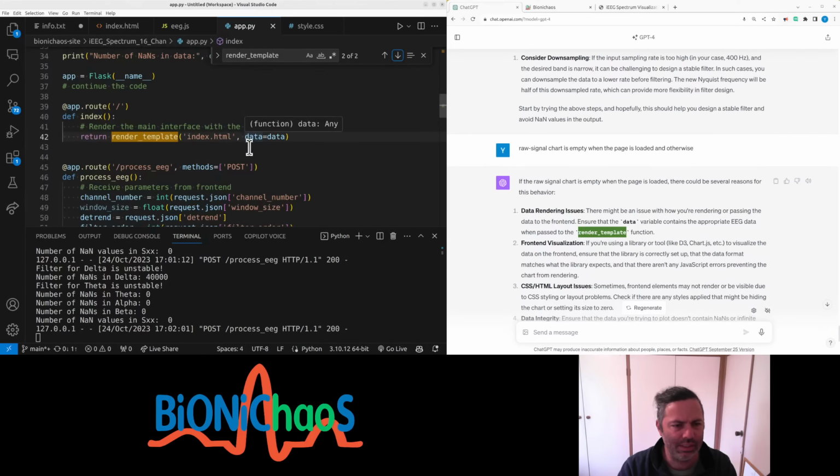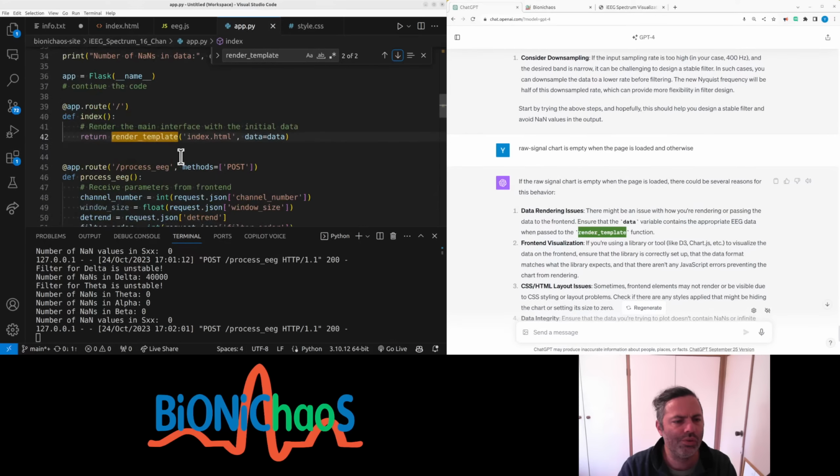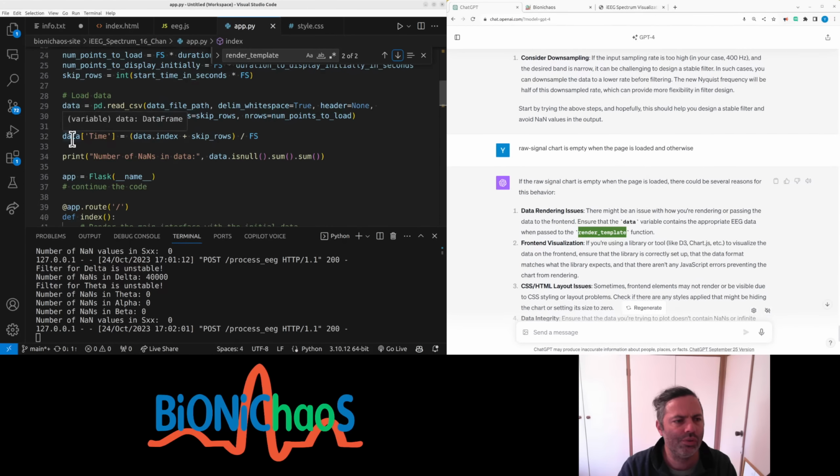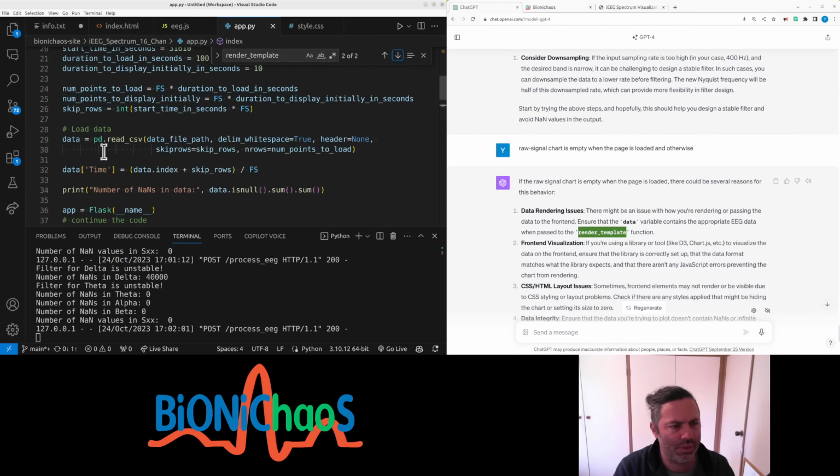Data equals data. Am I using the time? No. Pretty sure time is not being used.